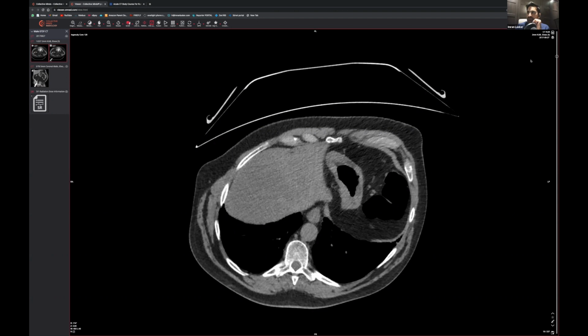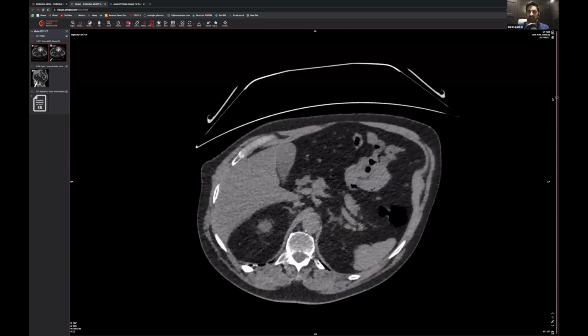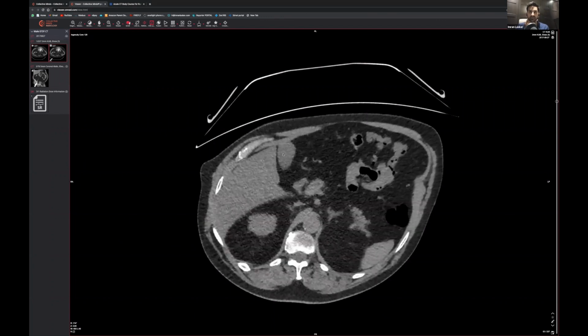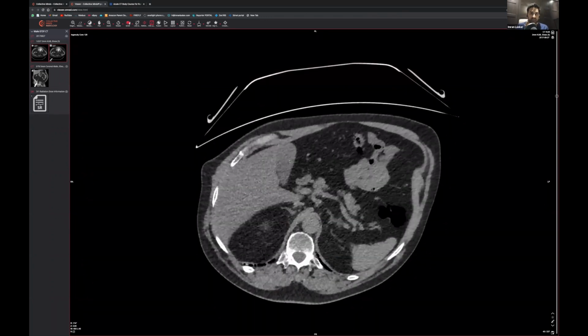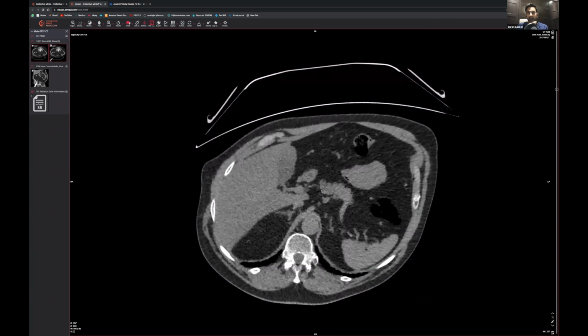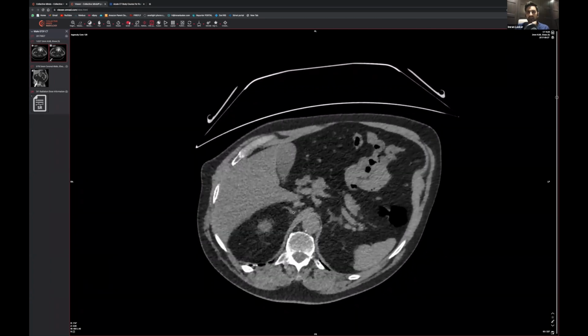Okay, well, let's go back to the bottom of the chat. Okay, so no new questions coming up. Let's go from the top here. Non-contrast scan, you can see there's no contrast. Again, gallbladder looks okay. Can you see there's a slight radiolucency sitting within that gallbladder? Sometimes you get cholesterol heavy stones and they will look very hypodense. So I would not be surprised if this patient's got a few tiny calculi that we can't see because they're not radiopaque. Again, pancreas, what does the pancreas look like? Pancreas looks okay, going along like so, no inflammation there.